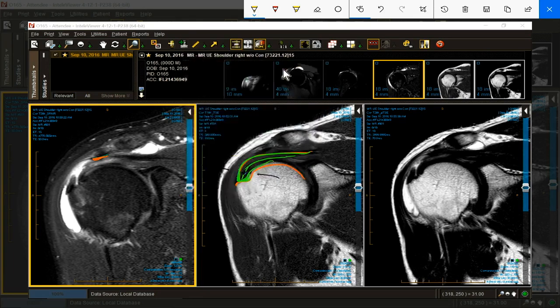What if I tore over here, right there, medial to the footprint, right along the humeral head? I'd call that an articular surface tear. Might go up into the tendon halfway, 3/4 of the way, all the way, or through as a pinhole.